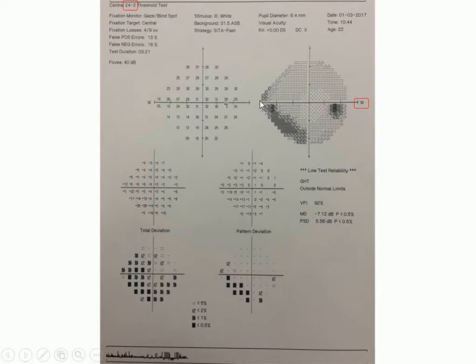And that was felt because for glaucoma and a lot of optic neuropathies, this 6 degrees here was still a very high yield area to test, and it shouldn't be sacrificed. And so this is why the visual field that's tested has this abnormal shape, where it's elongated on the nasal side instead of being circular.